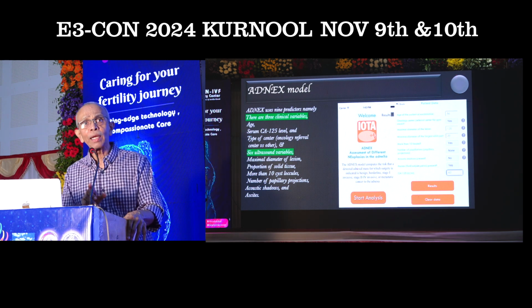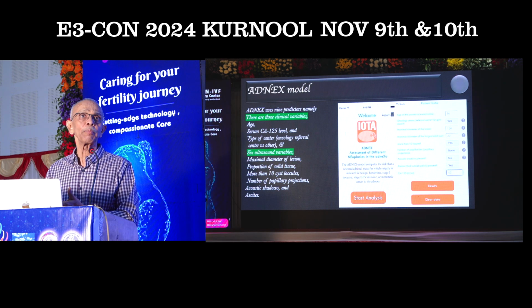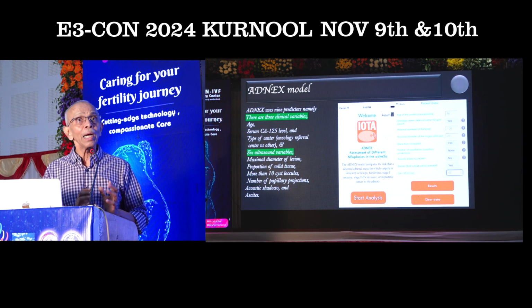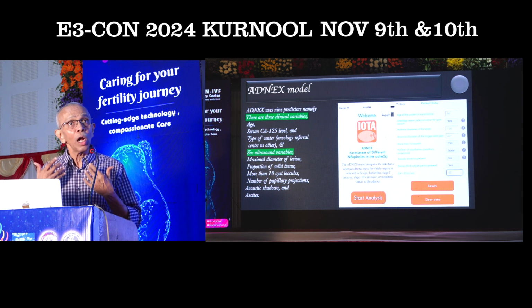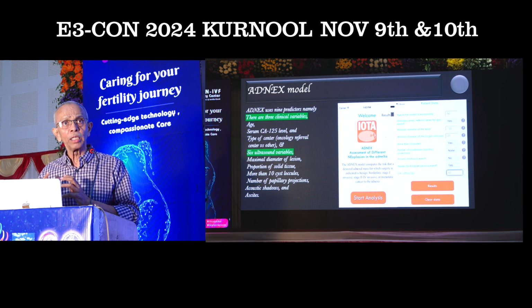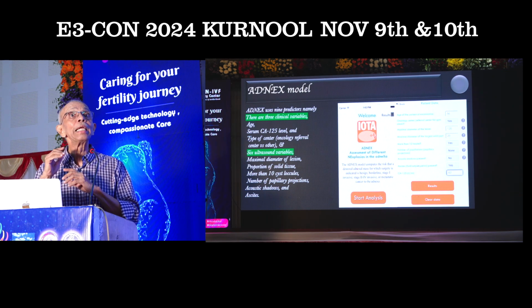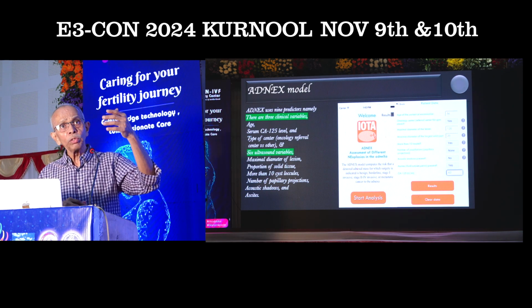Now you can identify that, as I told you before, I have not given any importance to the color at all in this particular ADNEX model. So color, yes, it is going to be helpful in identifying the vascularity, but it is not essential in order to categorize this 25% of the adnexal lesions which were inconclusive by using either the pattern recognition or by using the simple rules.